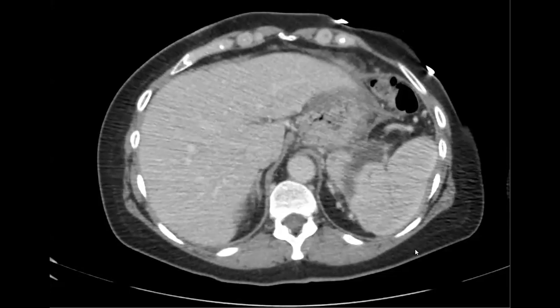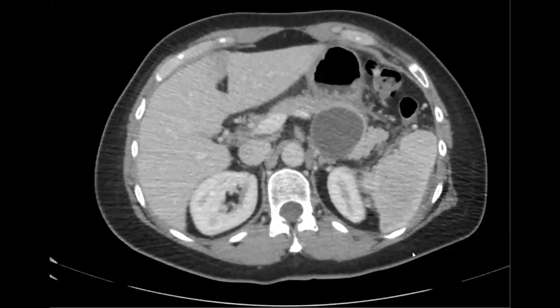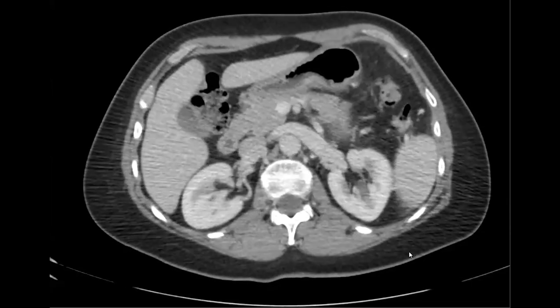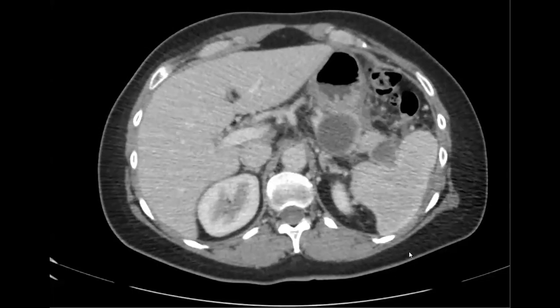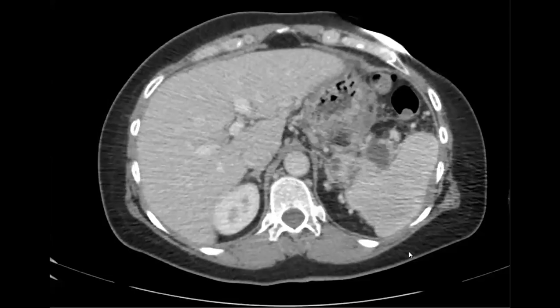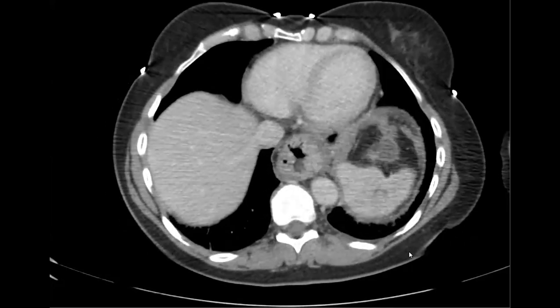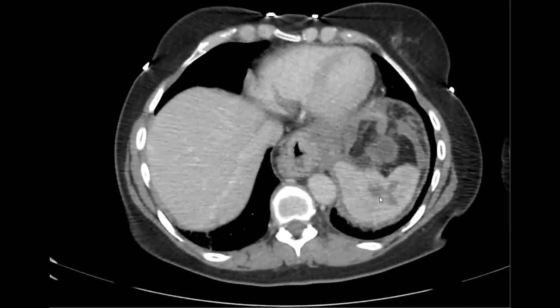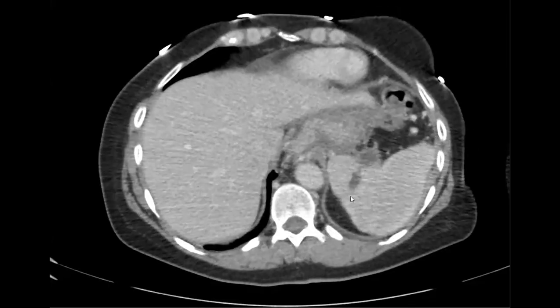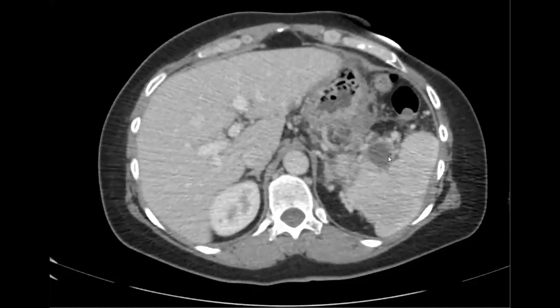Okay, so organized hematoma, or stuff happening in the tail of the pancreas and around it posteriorly, like in the spleen, and there's ischemia as well. So you're saying ischemia because you think these are infarcts, wedge-shaped stuff, or infiltration causing something? I don't know. And it's continuous with this fluid here.